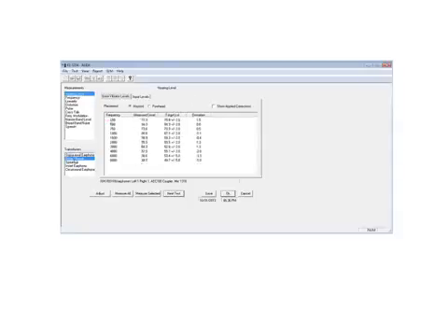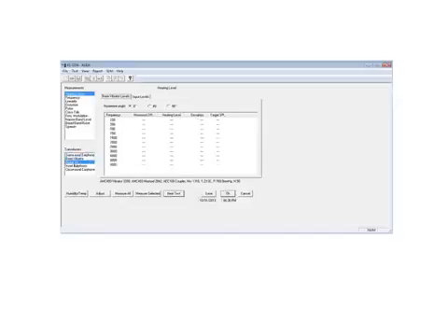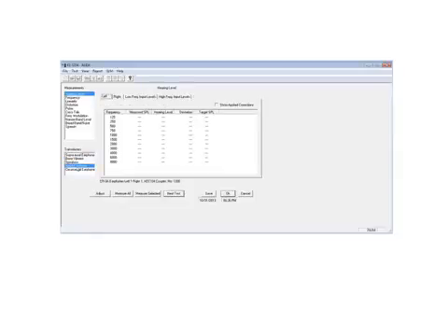We can also go and do the bone vibrator, again with the AUDit testing. Some clinics are set up with a nice sound booth, which would have speakers mounted in the booth, and so there may be speakers to test. The insert earphones can also be tested, and the last one in the list is called the circumaural earphone. They're a little more specialized. These are also sometimes referred to as the high-frequency earphones, as they will go up and accurately produce the 12,000 hertz and some of the higher frequencies that they may be interested in testing.